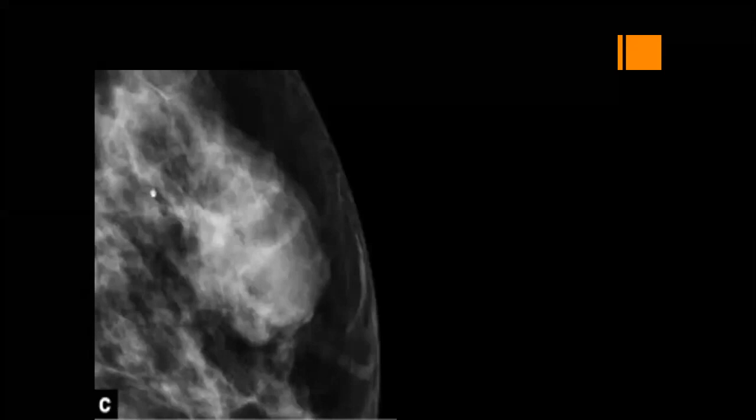And this fat containing area could just be the overlying breast.